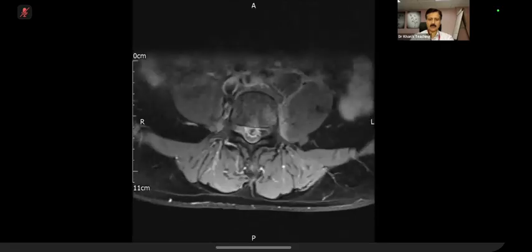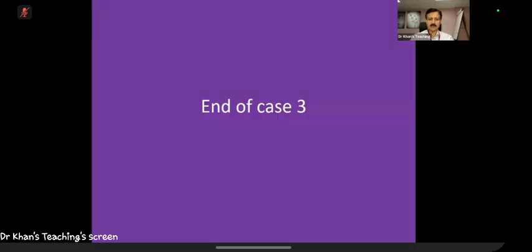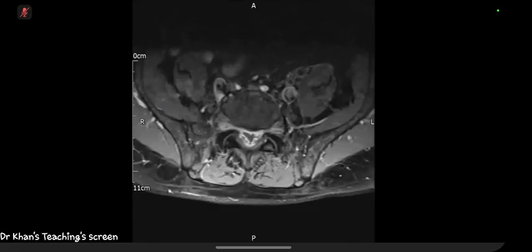Okay, so I can see there's multiple epidural abscesses causing... Go back. Sorry. Yeah. Okay. There are multiple epidural abscesses, effacing the cauda equina root posteriorly and causing crowding of the nerve root.